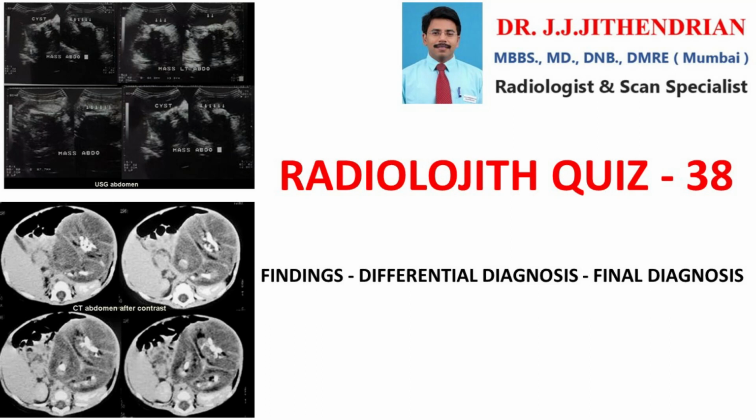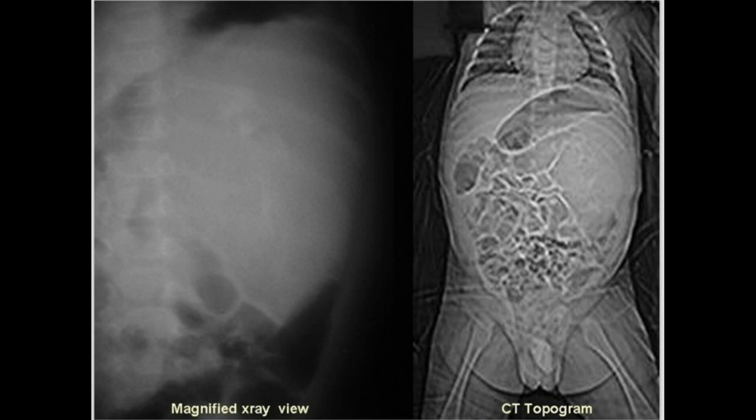Hello everyone. The given images are too old. The scans had been done 20 years back, but they're still enough for the diagnosis. So we'll go to the quiz.